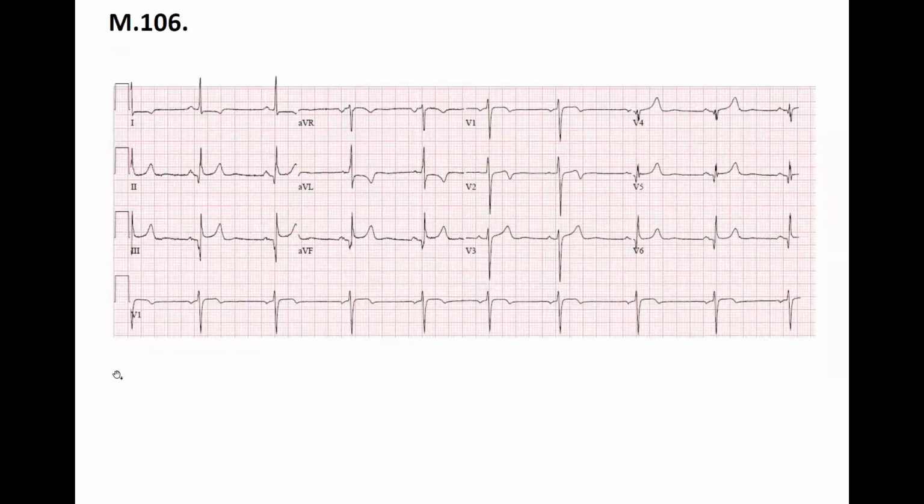Okay. So right off the bat, to evaluate rhythmicity, I think this is regular, because we're seeing about 5 spaces between the RR intervals. So it's roughly around 60 BPM. Oh yeah, a little bit less here, because this one is 6, 5.5, 5.5. So 5.5, I would almost say 6. So it's around the 50s or so. So it's bradycardic.